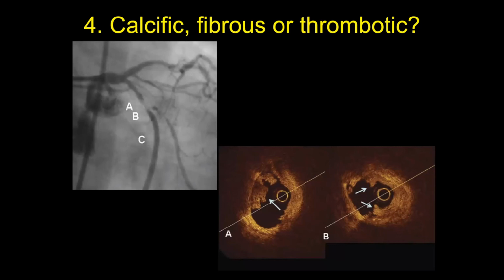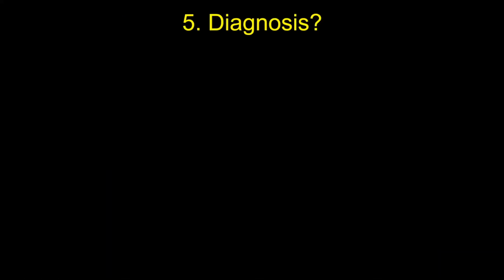Excellent, excellent. These are all much better interventionists than me, honestly speaking. They are senior and I have a lot of respect for them. The aim of this one was not to say that they can't tell what it is. It's on the basis of an angiogram without history, with just one view. It's almost impossible. I would definitely have scored 0 on this one. The point is just that with the angiogram, there is not enough information, enough resolution, enough depth to make some of these conclusions.